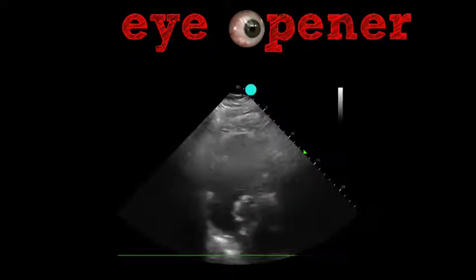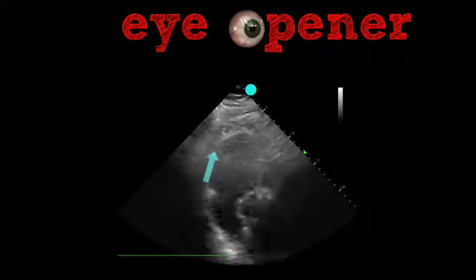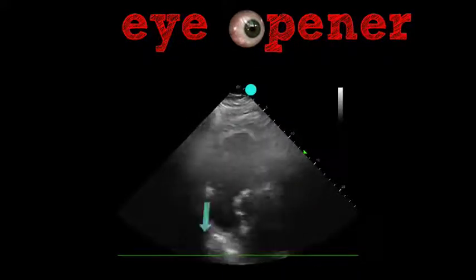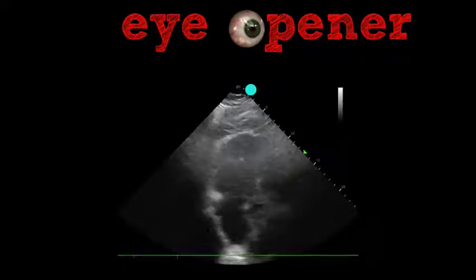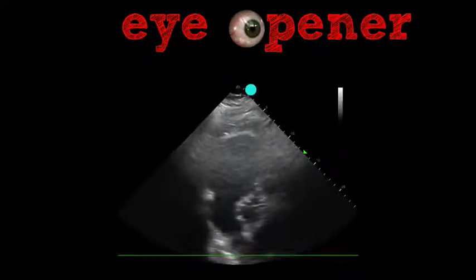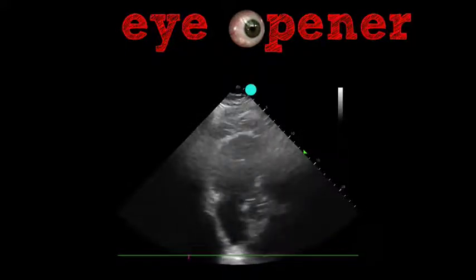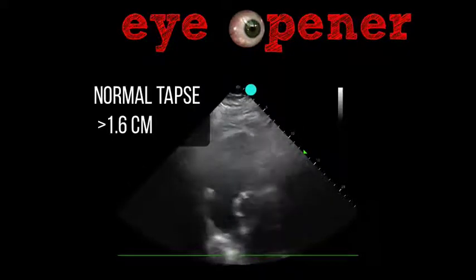It just means how much does that tricuspid annulus get pulled up towards the apex during systole, and then of course relax down that same amount during diastole. If it's a large number, greater than 1.6 centimeters, that tells us that RV myocardium is squeezing well and pulling that tricuspid annulus up towards the apex.